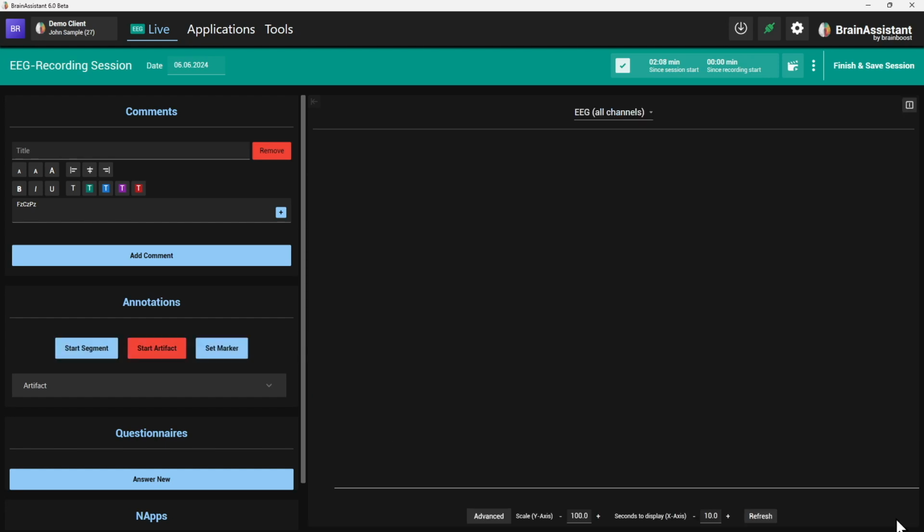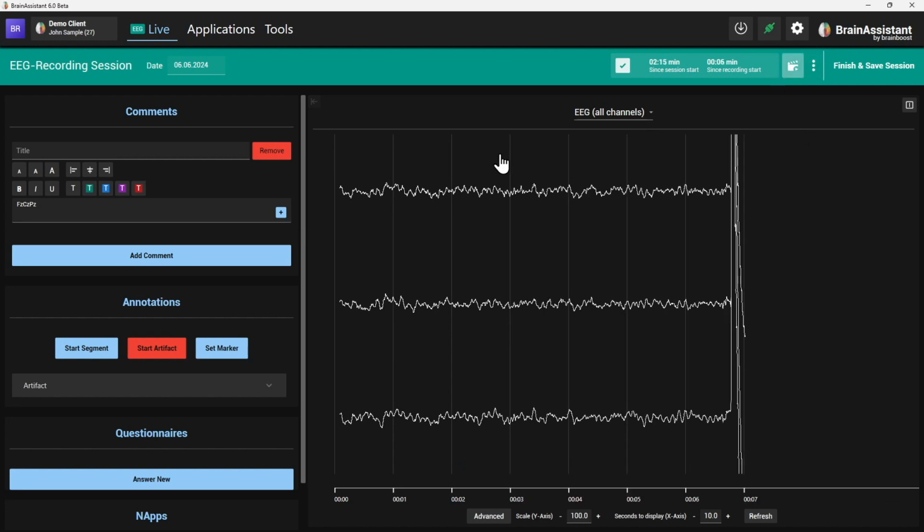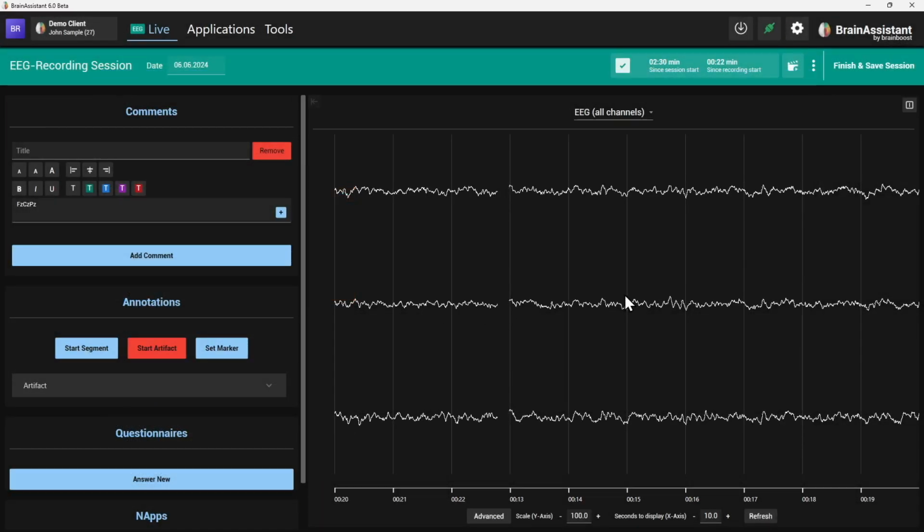And let's say start. I will come to the part, there are 2 webinars where I talk about this button here, a flow. So you can start a flow. I will come to that later in this webinar briefly. When you press that button, you can start a lot of different flows. The flow means that on your client screen, the second screen, there's now an automatic order of segment setting.